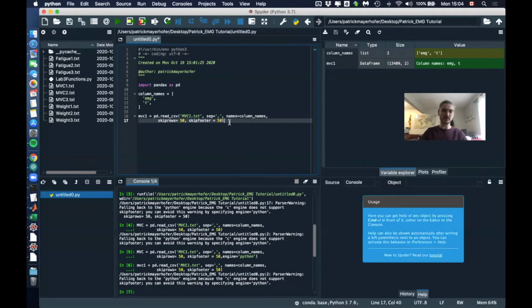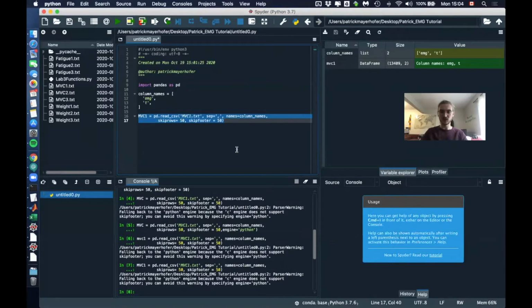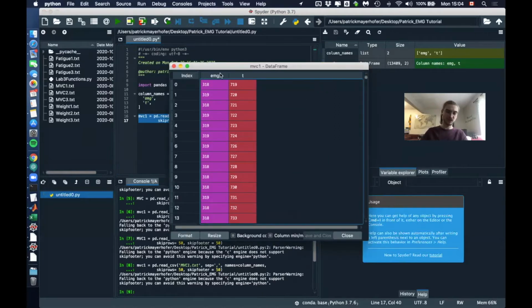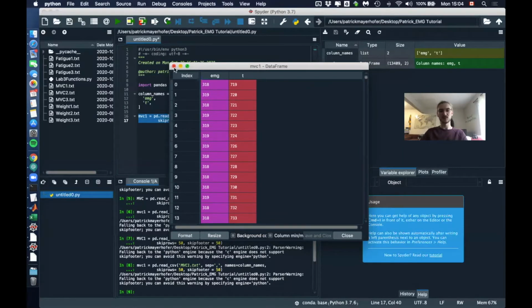I am back. So it turns out that you cannot, and I have no idea why, I'm also not going to look into this for now, but you cannot, like here, create a variable with capital letters. So if I try to run this here, run current line, that does not work, okay? That was new to me. But if you just use non-capital letters, then you'll actually get the variable which I wanted to show you guys. So now what we have is the first column is the EMG data, and the second column is the time data, finally.